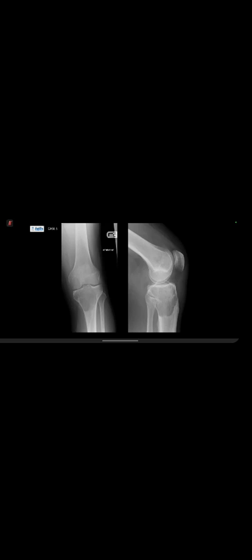There is also fine trabeculation inside. This is extending to the articular surface. In this mature bone, I will go with giant cell tumor. I don't see any fracture of the surrounding cortices. I don't see any soft tissue mass. So this is a giant cell tumor for the patient.